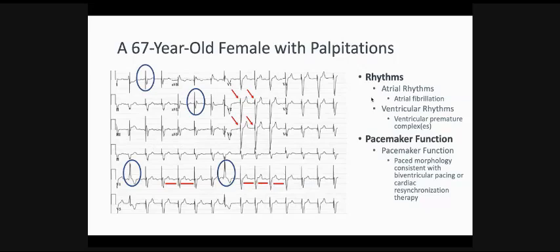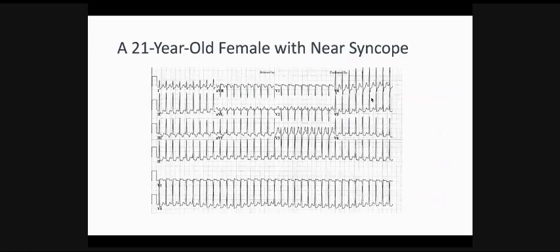So always don't panic and take things one by one. And I think I got some of the answers right. So this is an atrial fibrillation. There is a paced ventricular rhythm, and there are premature ventricular complexes as well. Don't panic or overcode things. Once you get these, believe me, the examiner wants you to concentrate on just these few things. Don't go over the ischemia or the other things, because this is what overcoding is.